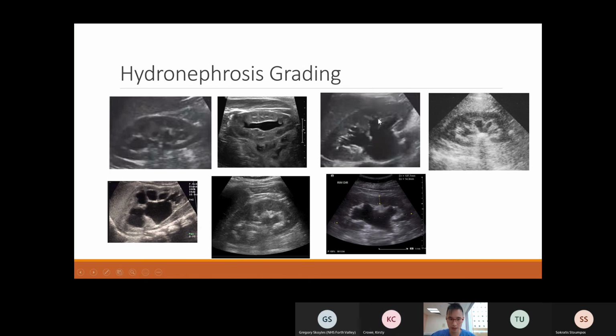severe hydronephrosis. And a similar picture here on the bottom left, you can see very obviously that your pyramid up here is squashed and your cortex is thin. So this is severe hydronephrosis. Okay, and just in the interest of time, I'll just go through this one myself. Here as well, the renal pelvis has been dilated, your calyces have been dilated, and maybe I would say that there's squashing of your medulla. So I would say this is severe as well. Important point that I wanted to say earlier about interconnectivity. The black bits are interconnected with your ureter, interconnected with your pelvis, and interconnected with your calyx.